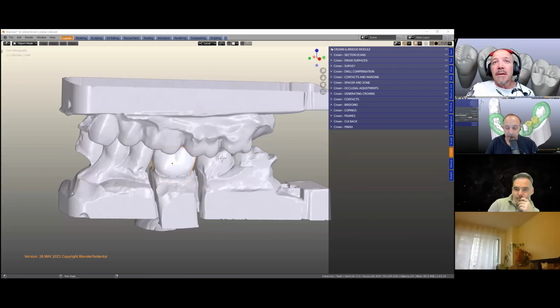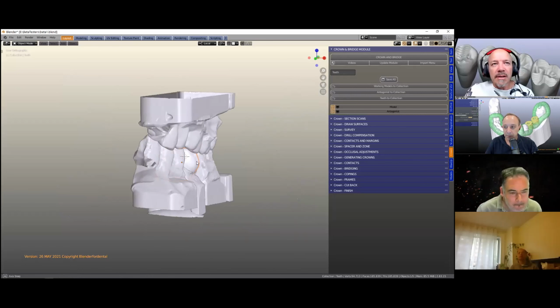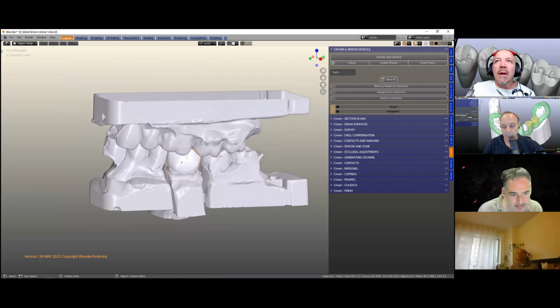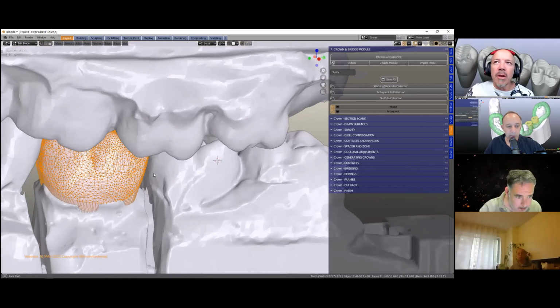Okay, let's just continue. Viewing it from the front, this has been put into the center with the model designer, as we always do. What I've done is I've passed this one through into the working model and the crown. I don't know if the crown is yet. No, that crown is a tooth library. I'm going to remesh it.